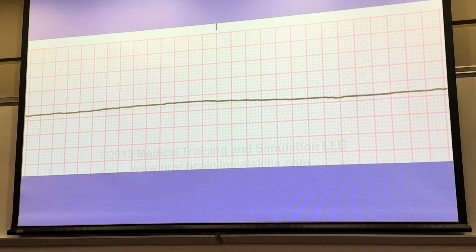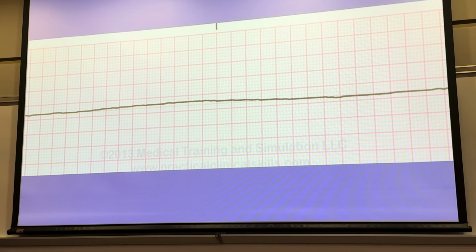All right, so let's start interpreting some. Josh, what do I have right here? Asystole, okay. What should I do about asystole? CPR initially? Check the pulse. Check a pulse, right? Just because the monitor says asystole or you have a flat line, does that mean your patient's in asystole? Not necessarily. Maybe the leads just came undone. If he's up walking around, he's not in asystole. Probably don't even need to check a pulse at that point. Just put his stickers back on him, tell him to get back in the bed, right?